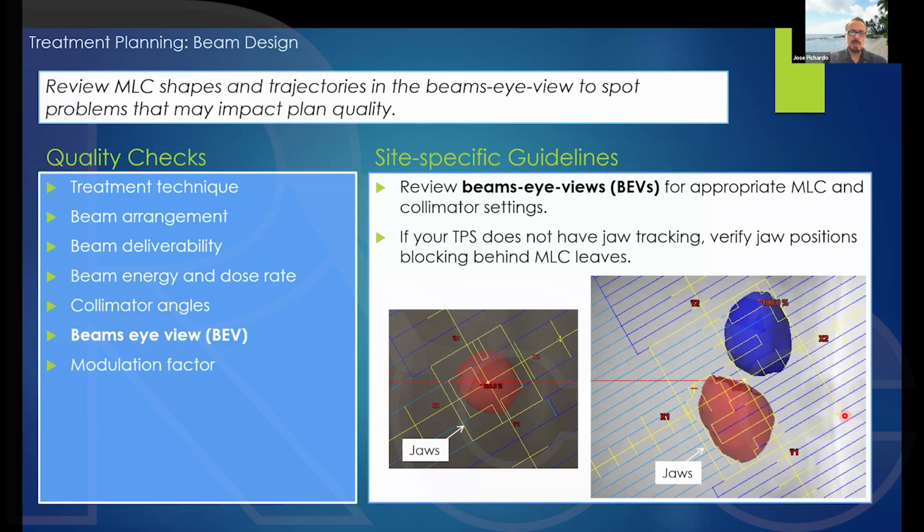And then on the right, you have an example with 2 lesions, right? The collimator size is set by the dosimetrist during the plan. Unless you have HyperArc, I guess, or some fancy elements, Brainlab Elements, it's not set by an algorithm. It's set manually. You do have the option in Eclipse to calculate, like you can tell it what you want to conform it to, and you can even give it an extra margin around that size.